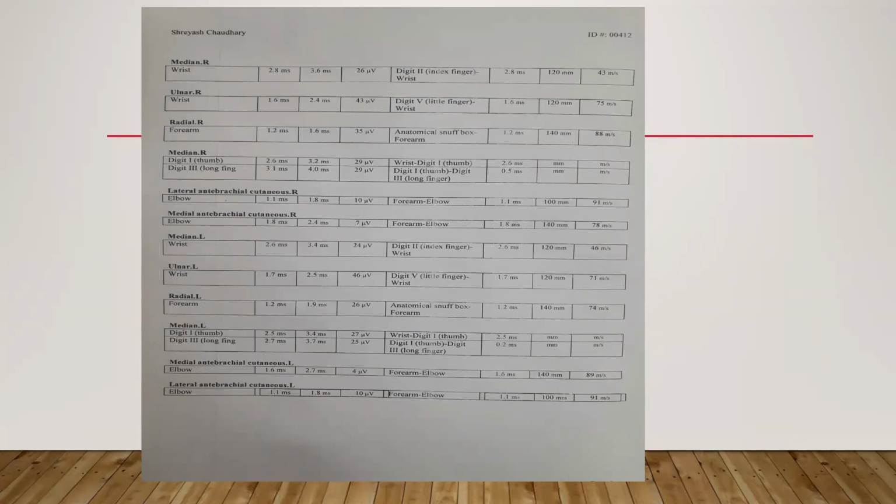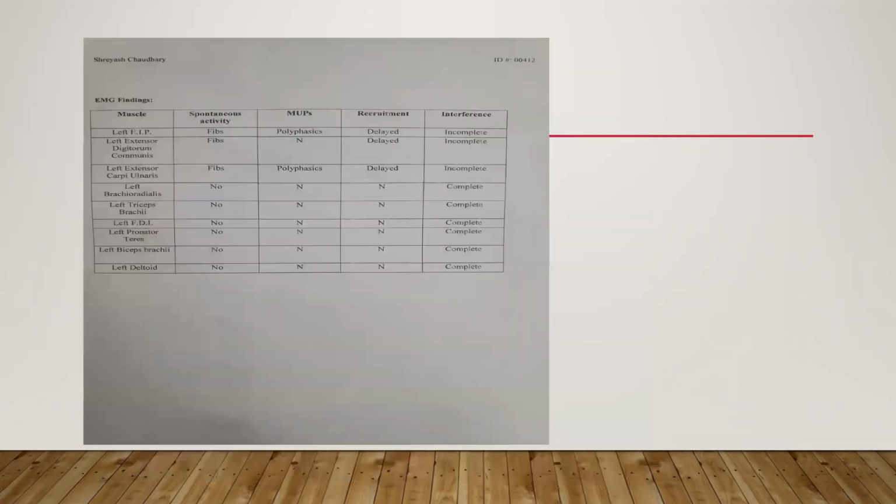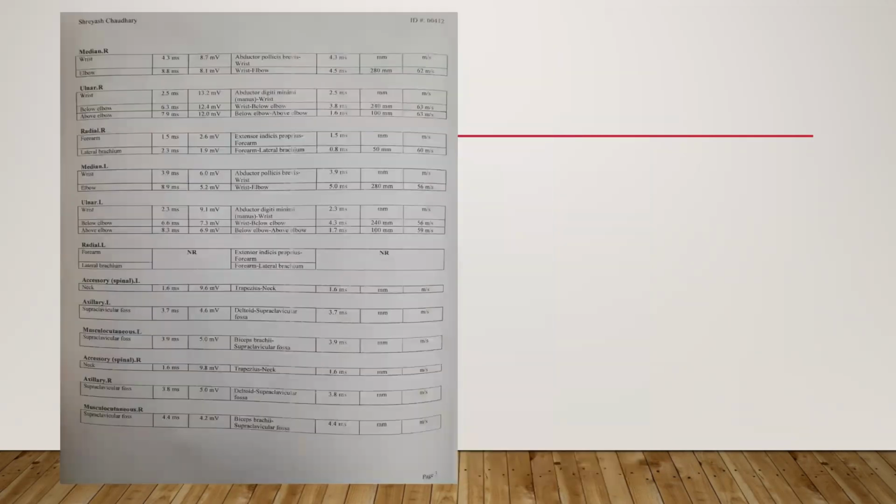So everything looks normal. So it should be preganglionic, meaning root involvement, ma'am. It could be root involvement or cortical. Those were the possibilities we had kept. But these were all SNAPs only. We have not discussed the CMAPs yet. This is the CMAPs.